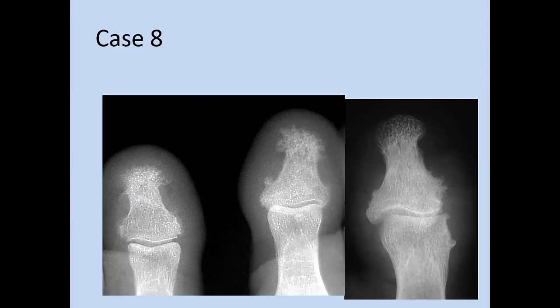Okay, X-ray of the fingers, frontal view showing the tuft of the distal phalanx, irregularity and erosion, more on the anterior or the tuft region. Also, the distal interphalangeal joint shows some irregularity and sclerosis with marginal osteophytes. So all features going also with psoriasis, psoriatic finger.